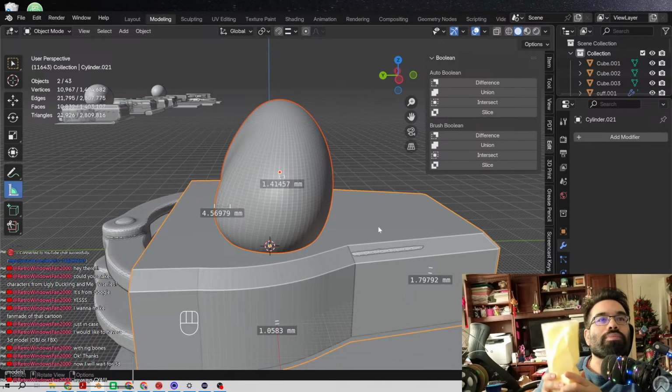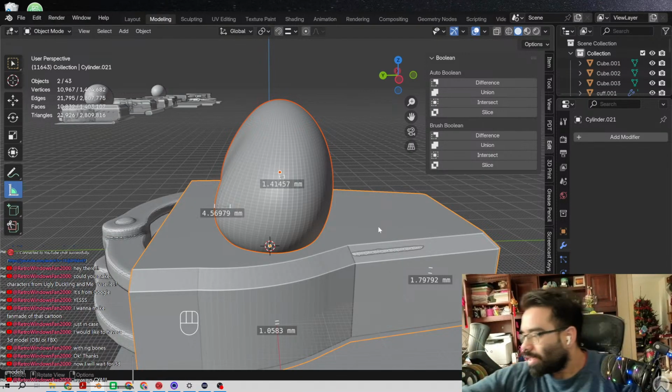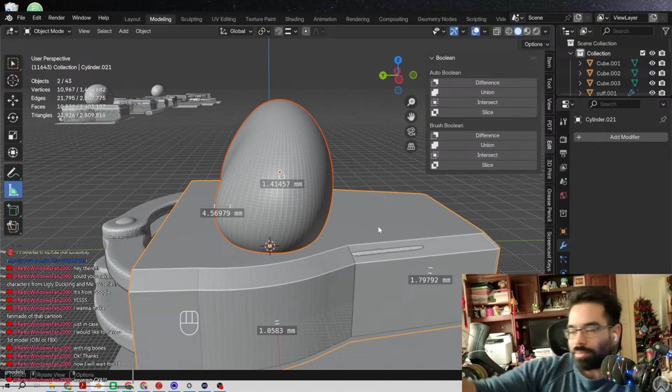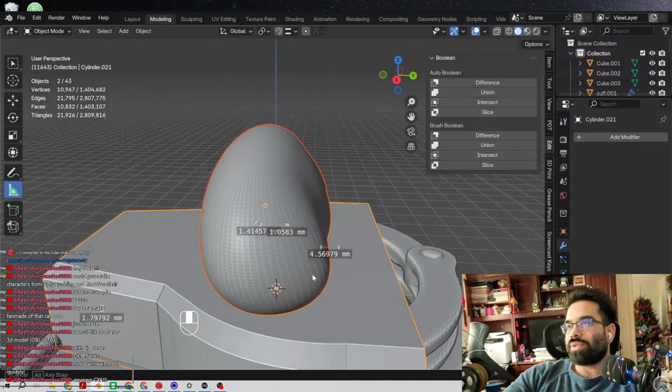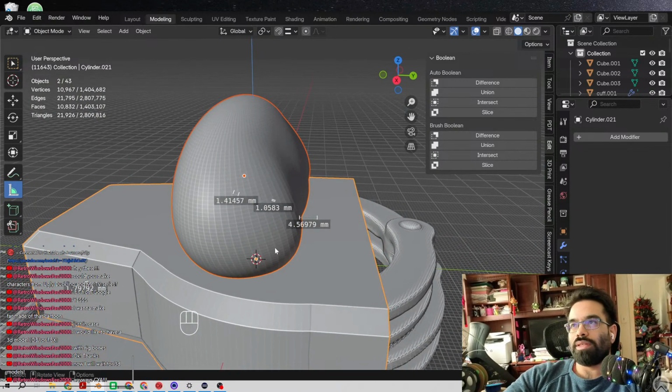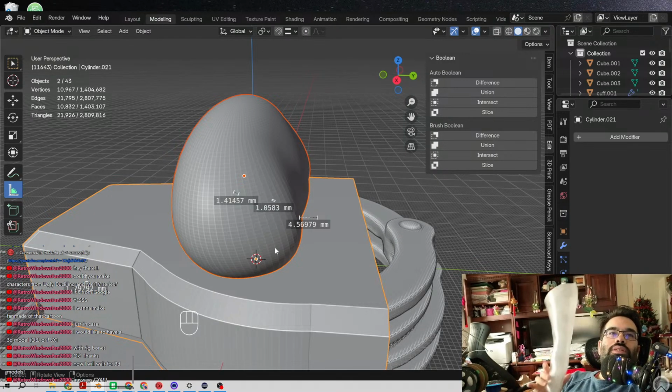But this is 3D printed out of dissolvable plastic, and then I'll laminate these with carbon fiber after I'm done modeling them, and then I'll grind the carbon fiber and send it out to clinics that use my prosthetic stuff. You know, I'll do legs too. Like this is a prosthetic leg.